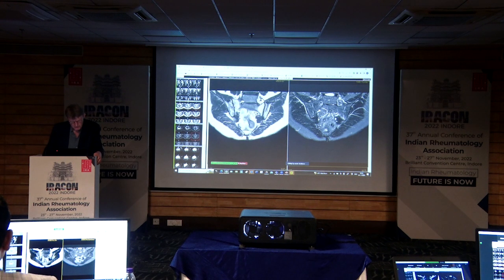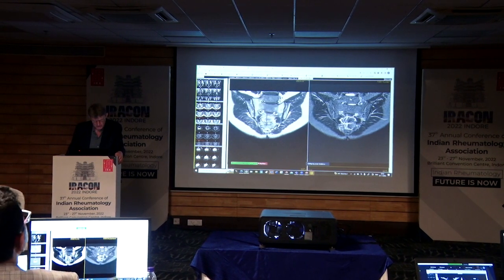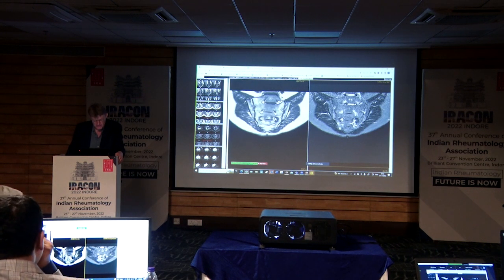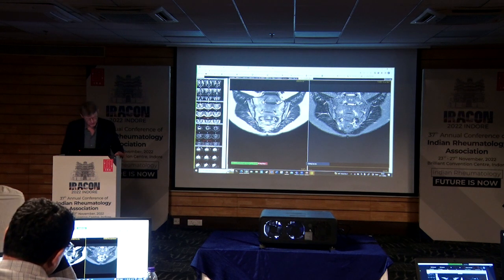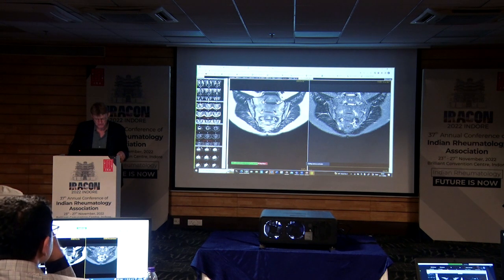There are erosions and also irregularities which are not so large that you can really be sure it's erosions. But there's no doubt that this surface is not normal. Here you could say it's only irregularities. In this one, here there is an erosion there. And then there are two things which several of you pointed out 100% correctly, but also had some doubts about things like this and this. And it looks like erosion, particularly this one does.